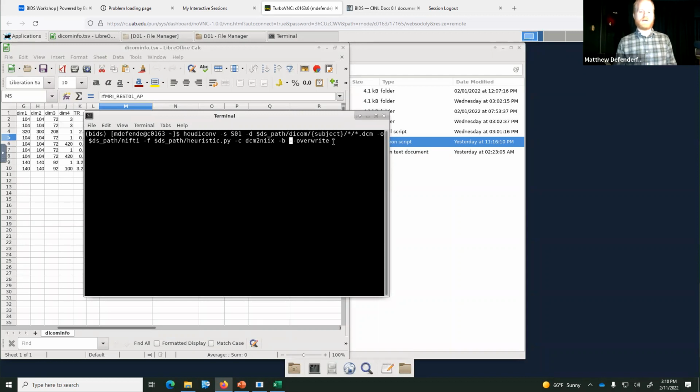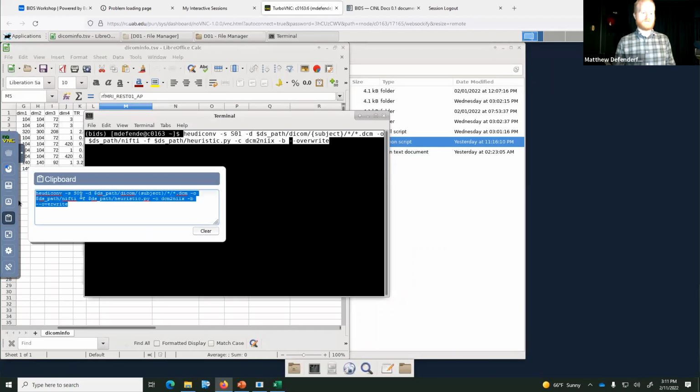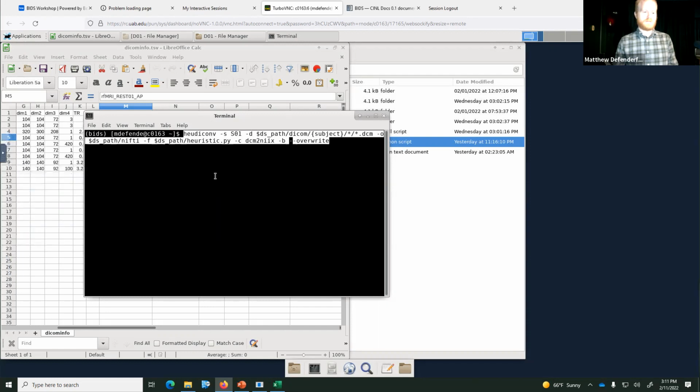And I'll go ahead and copy paste this into the chat, just in case people have transcription problems. There you go. Okay. So we'll go ahead and run this.